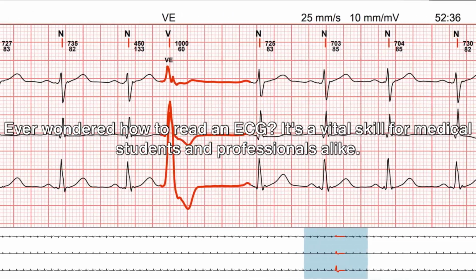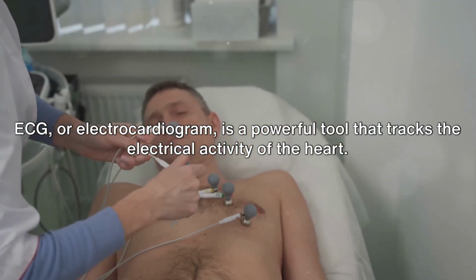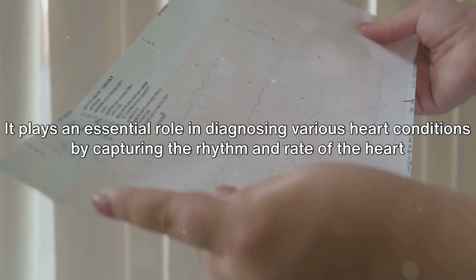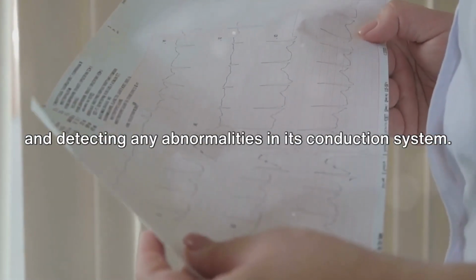Ever wondered how to read an ECG? It's a vital skill for medical students and professionals alike. ECG, or electrocardiogram, is a powerful tool that tracks the electrical activity of the heart. It plays an essential role in diagnosing various heart conditions by capturing the rhythm and rate of the heart and detecting any abnormalities in its conduction system.